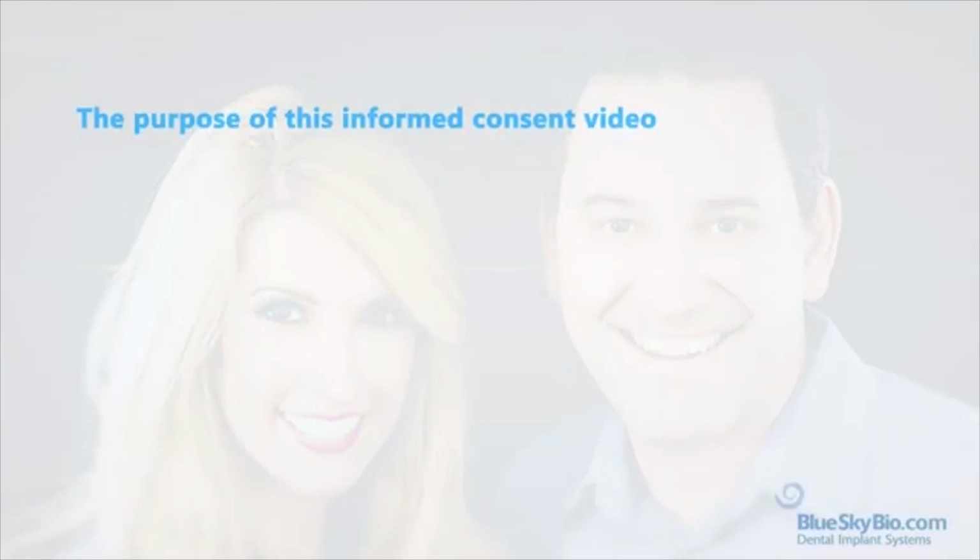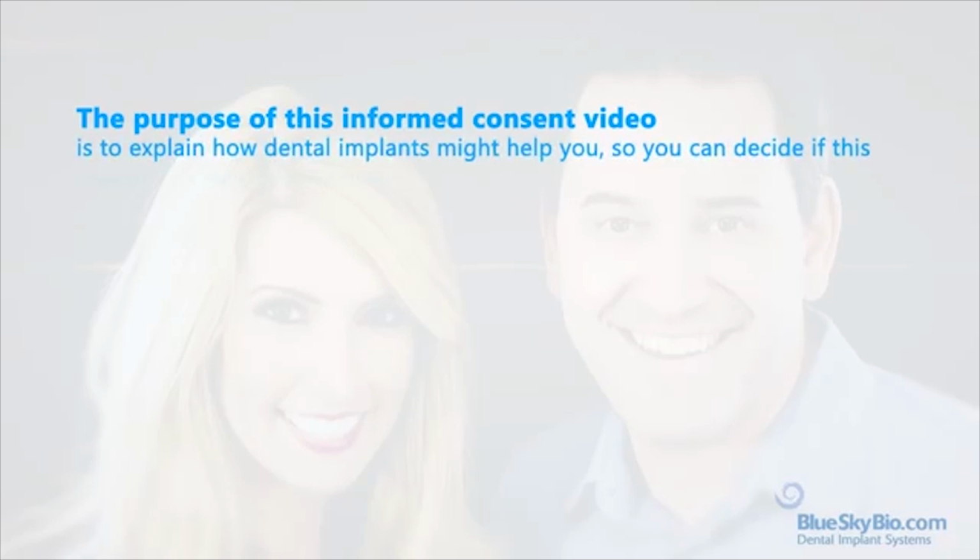Are you ready to get one or several dental implants to replace missing teeth? The purpose of this informed consent video is to explain how dental implants might help you, so you can decide if this treatment could be beneficial.